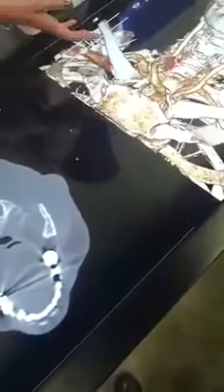So here we have a post-operative scan of a patient with a brain aneurysm, and this is the actual CT that was provided. You can go ahead and slide through the CT and see exactly where the clips were placed as well. So if I go down here, it'll show where it is. And same functionality as before.